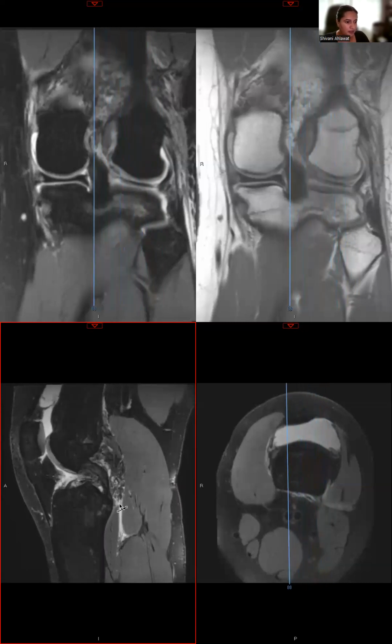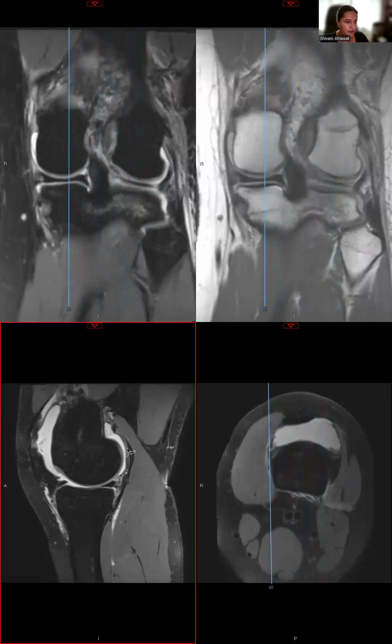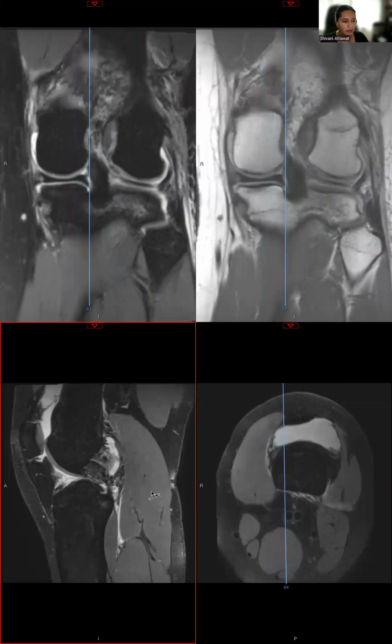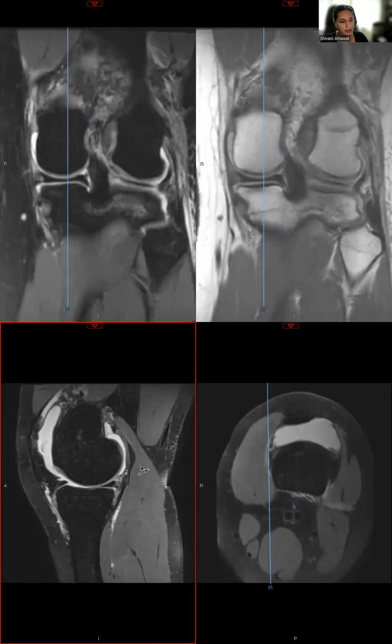Now, what about the medial meniscus? Here we are able to see frank fluid signal at the capsular attachment, which in a deficient ACL or ACL tear is a special kind of meniscal capsular separation. We call it a ramp lesion, and it's a clinically significant lesion. So look out for that, the meniscal capsular attachment. There should not be fluid back here.